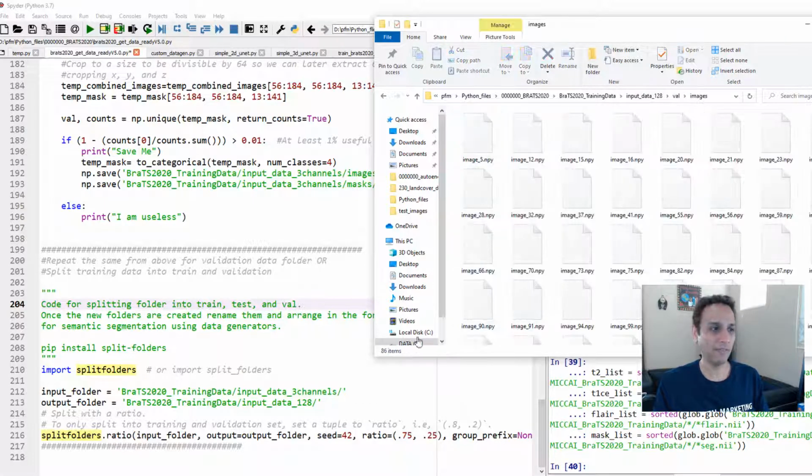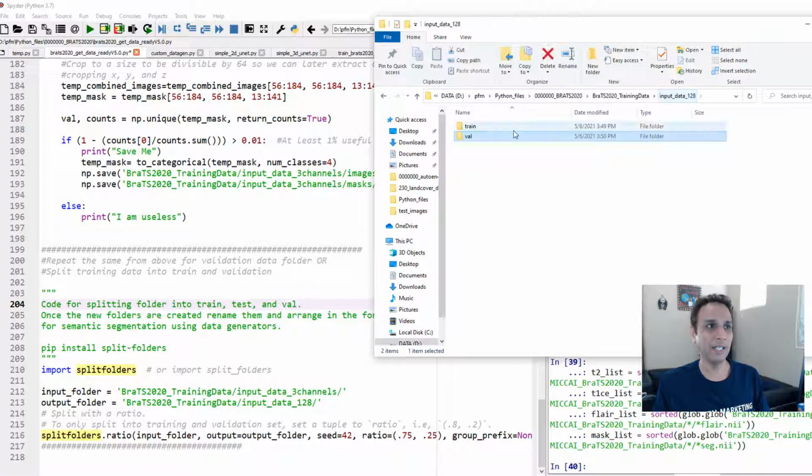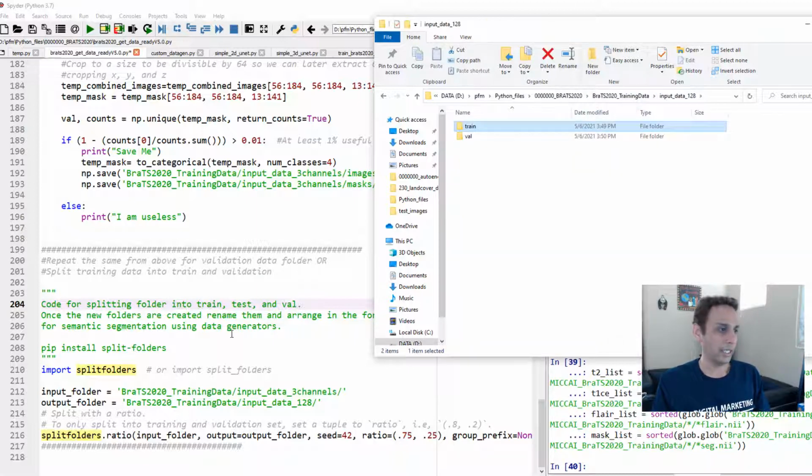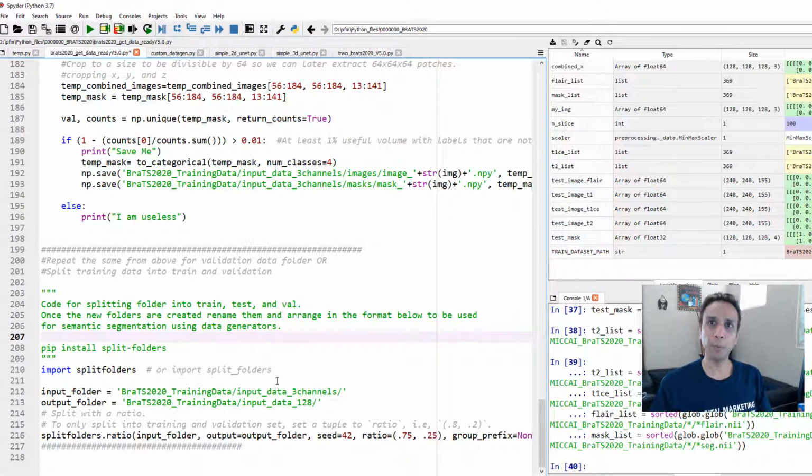Here I have 86 images, and for training I have 258 NumPy arrays. So that's a lot, but I hope it gives you a good familiarity with the dataset. Again, now you understand why I'm dividing this into multiple videos, because we want to focus on one thing at a time and slowly get to our goal.